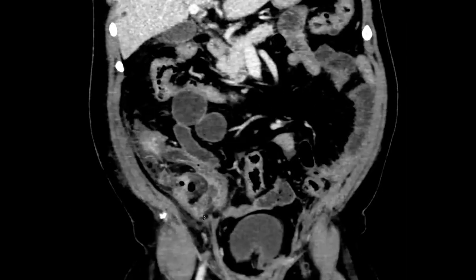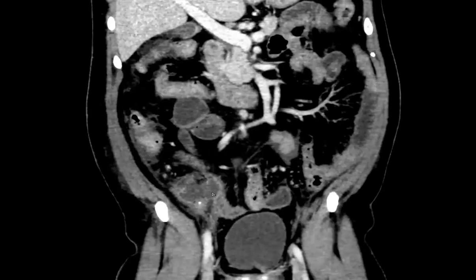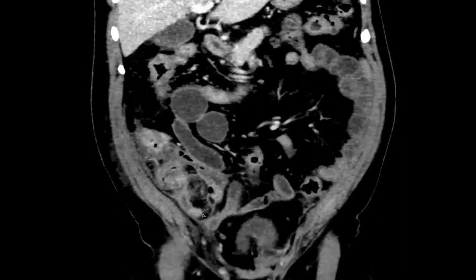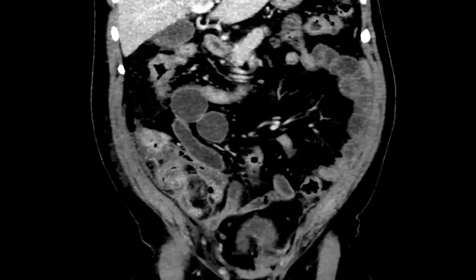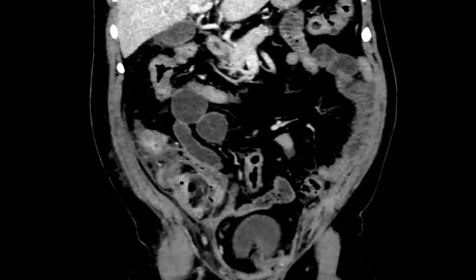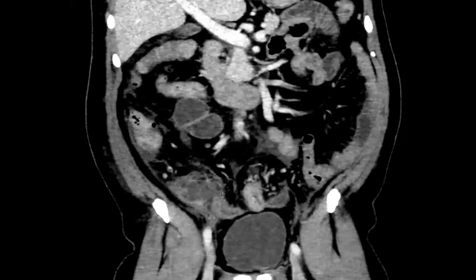And this, we are assuming, is what caused obstruction. And then the dehiscent wall of the appendix is distally. So basically they saw a met from the sigmoid colon. This was a metastatic adenocarcinoma to the appendiceal lumen, which we are assuming caused the appendicular perforation.